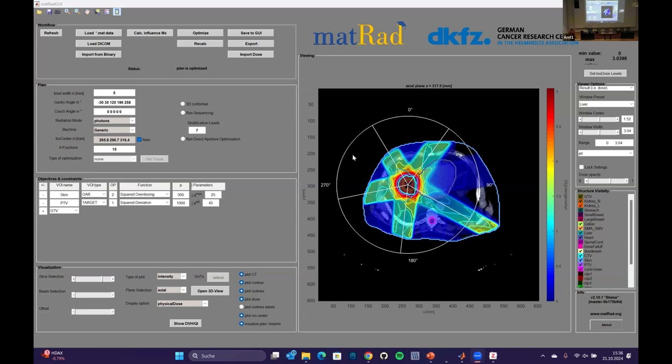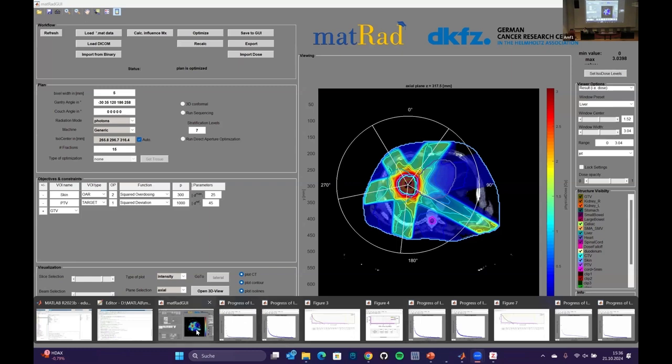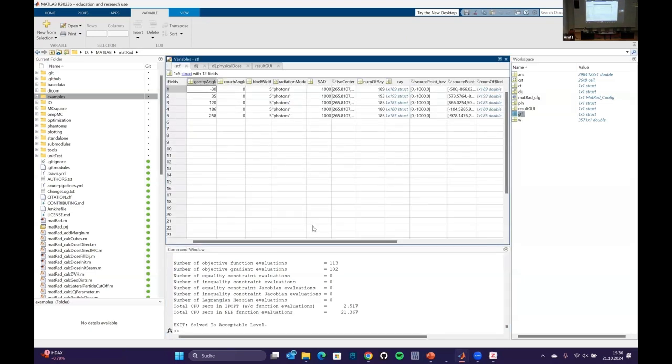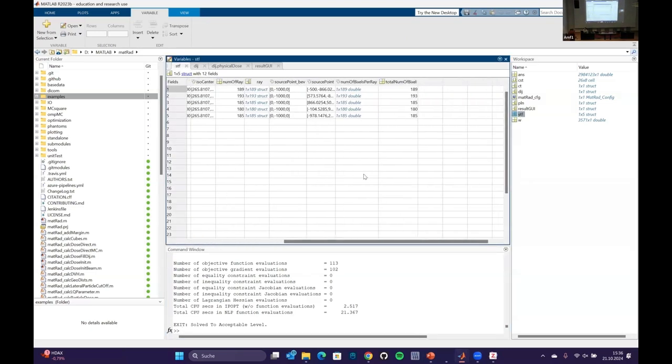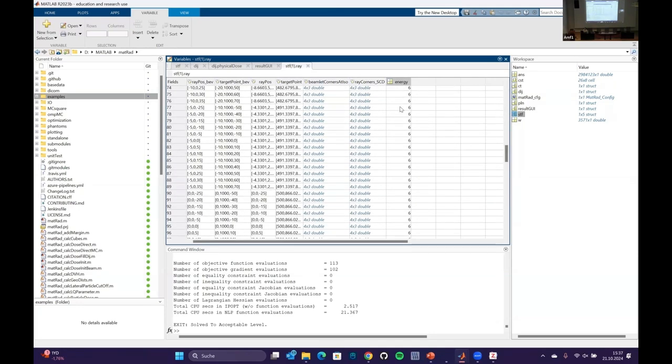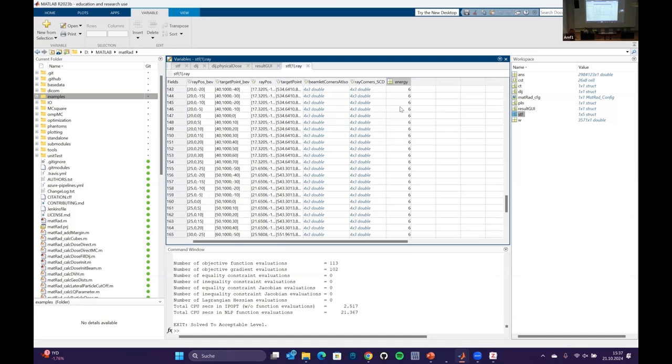So again, just for the interested ones, if you go into protons, basically, if you go into the geometry that you generate, this is now for photons, but it's kind of similar for protons in case of transmission beams. Basically, we just write the energy that we use for each beamlet into this matrix here. So you need to just hack this geometry a little bit.